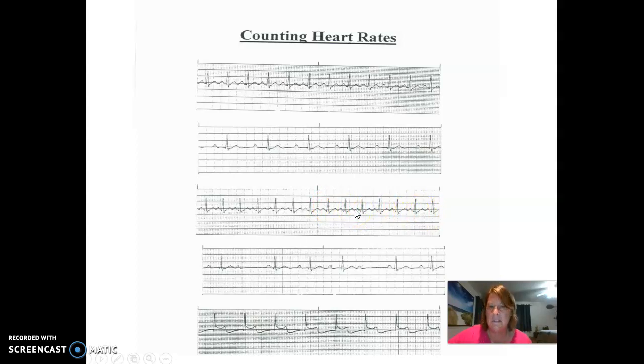So I can tell it's obviously going a little bit fast. And one thing you're going to notice when you start having faster heart rates is, here, I have my P, my QRS, and my T, and then that next P, that P and that T are coming really close to blending together. Next week, when we start looking at more rhythms coming from the sinus node, we're going to see that a lot of times when rates are really fast, those P and those T's blend together where it's even hard to differentiate them.